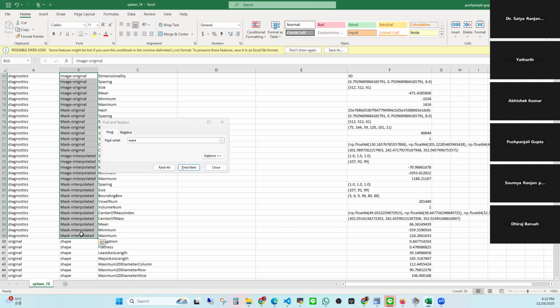And from that, you can do the analysis and select whether you need all 1300 features, or you can reduce the features and go for a feature ablation or some kind of study to find the best or the most influential feature in differentiating spleen or pancreatic tumor versus liver tumor, something like this.